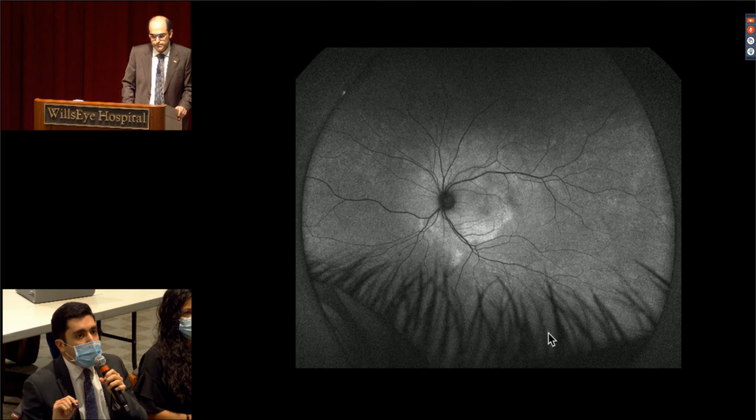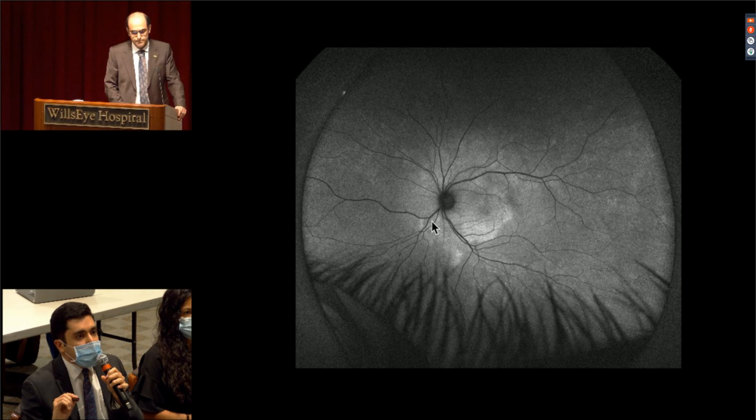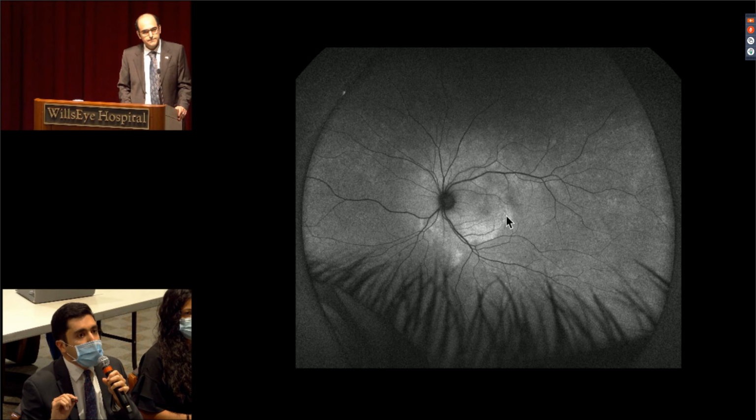And same imaging modality of the left eye. More distinctly, we can see this hyperfluorescence pattern of the posterior pole. It corresponds to that central lesion we were seeing on the color photos, but it does actually go past the arcades, both superiorly and inferiorly, and almost has this peripapillary appearance to it, as well as involving the central macula. In addition, we are also seeing those similar, almost granular appearing changes in the mid-periphery, once again, temporally and also nasally as well.